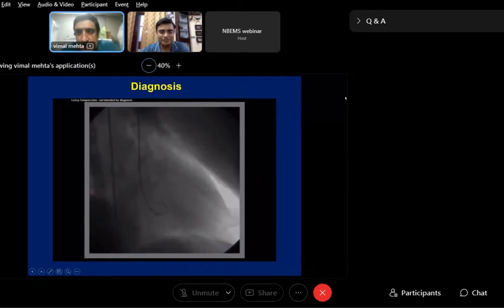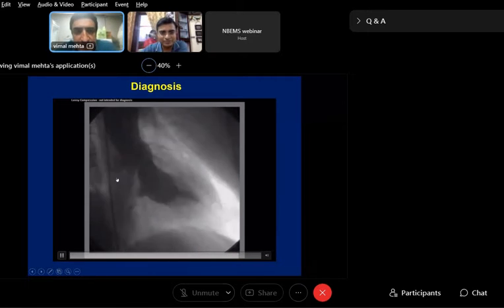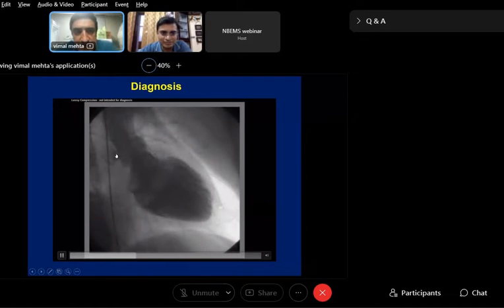See, somebody has nicely said aortic regurgitation. It is not. For aortic regurgitation, this catheter is not the right one to tell you about that. Reason being, once the catheter is there, then the leaflets cannot coapt adequately. So there will be inherent aortic regurgitation. Very good. Somebody has, at least to some extent, rightly said RSOV closure. It is not like that, but nevertheless, very near full marks. It is actually an unruptured calcified aneurysm.